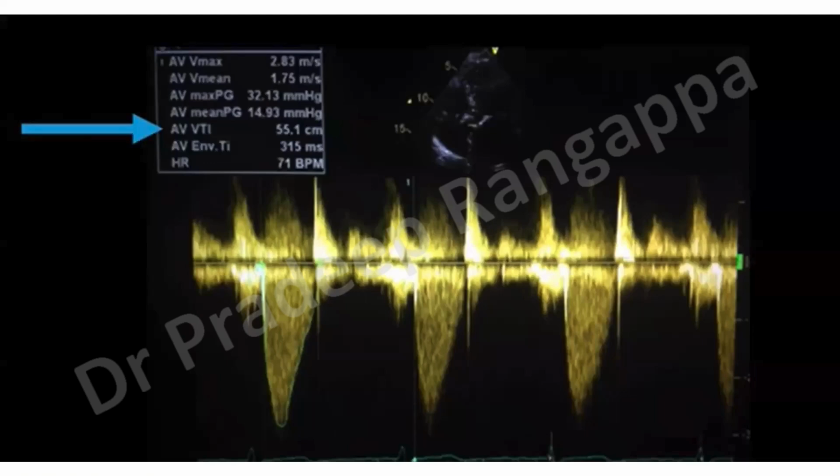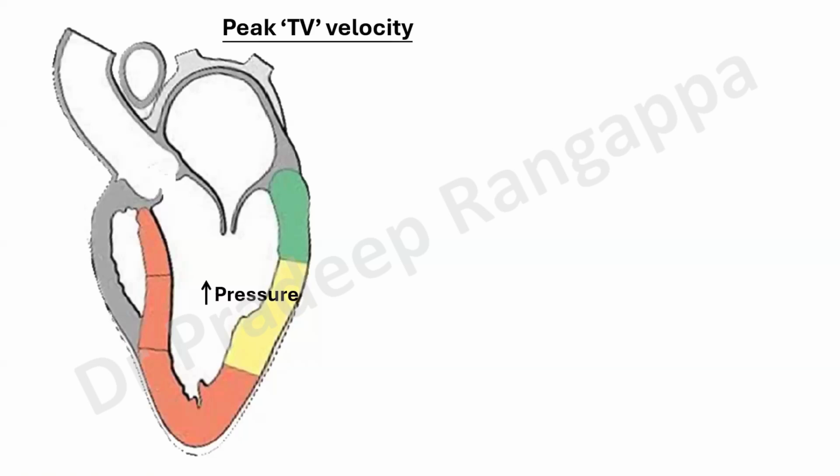This is just a pictorial representation where again you have placed the cursor at the LVOT and at the aorta, and you placed a continuous wave Doppler. So here you get the aortic valve VTI. That's about the aortic valve.